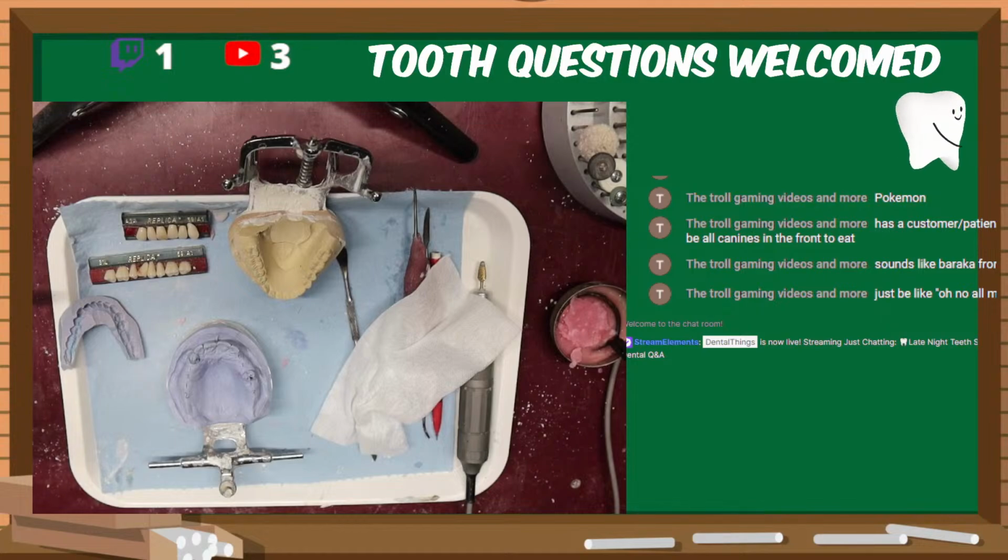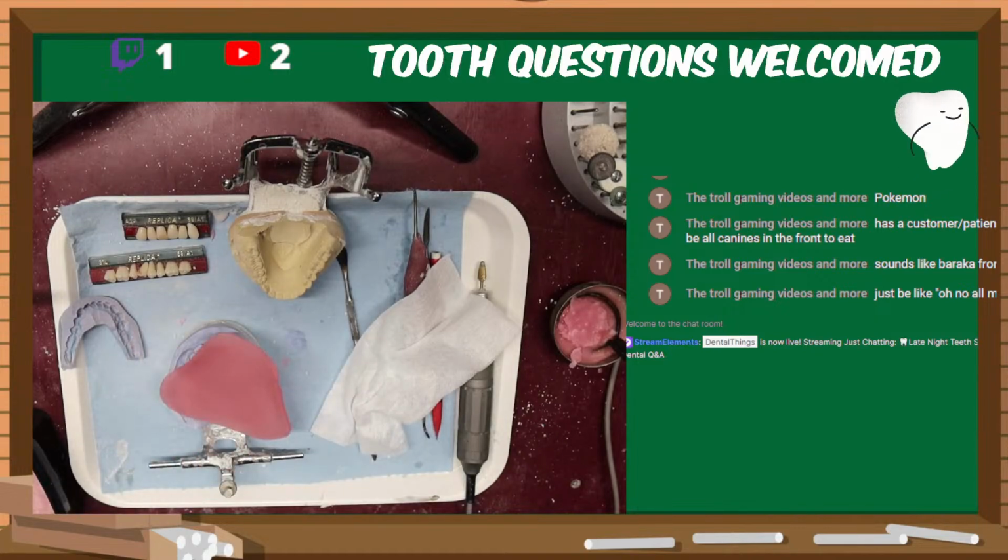Alright, so I really should keep some of these scrap pieces instead of wadding them up like I usually do. It'd be sweet for a situation like this. Yeah, it looks like I've cut them all. Well, goodness gracious. Let's go ahead and just make a new one then. Maybe I'll remember it this time to not go and mutilate the extras that come from it.